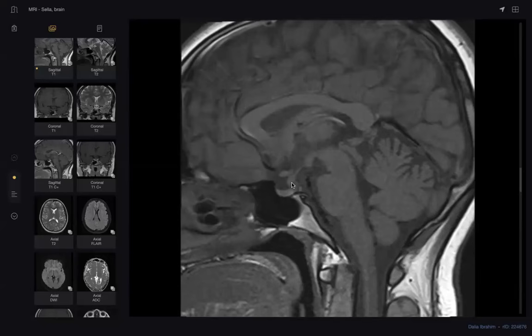The presentation is usually not diabetes insipidus. In hypothalamic hamartoma, you will find a normal T1 high signal of the pituitary. What else? What are the causes of loss of normal high T1 of the posterior pituitary? Adenoma, microadenoma of the gland. What else? The most common.